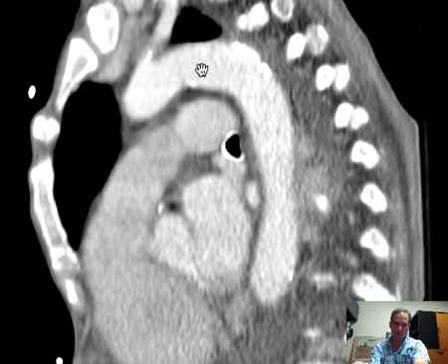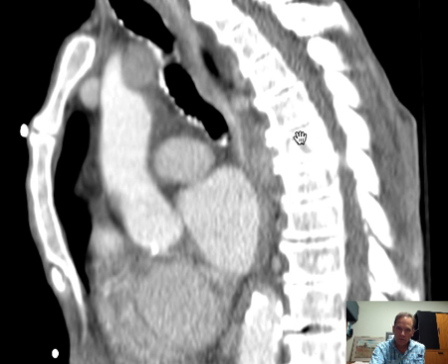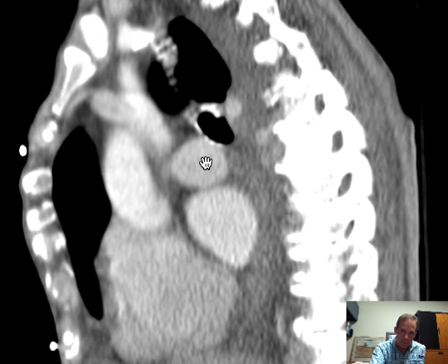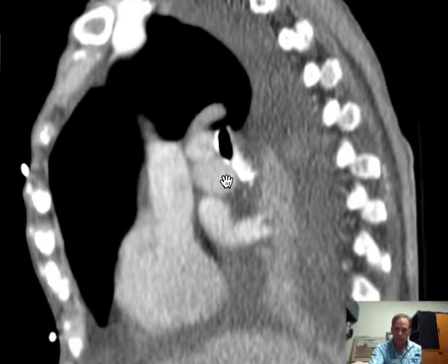So now you can see the aortic arch and the descending thoracic aorta, and you see what happens is the main pulmonary artery comes out very anteriorly from the right ventricle and then dives back. It dives back and divides beneath, inferior to the aortic arch. Let's see what that division looks like. We don't see it in this plane. We saw it nicely on the other. Now if I go off to the right, watch what happens right here. And you see that this vessel right here continues. So let's go back.